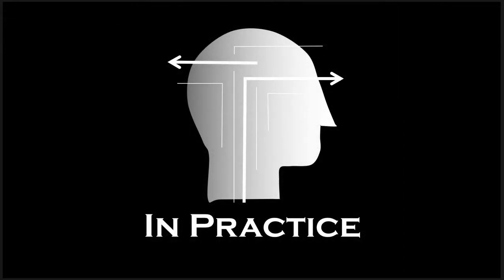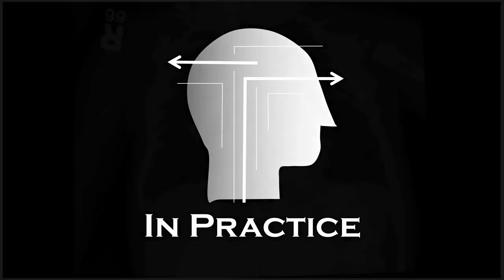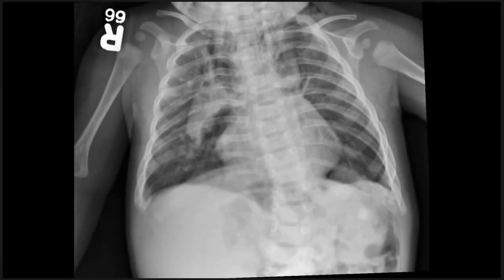Play a little bit more. Here's a peds case. Alright, so it's funny looking.